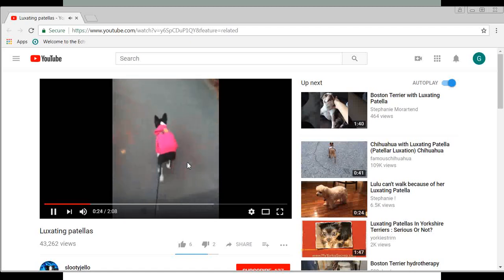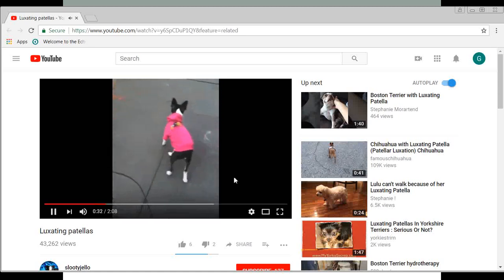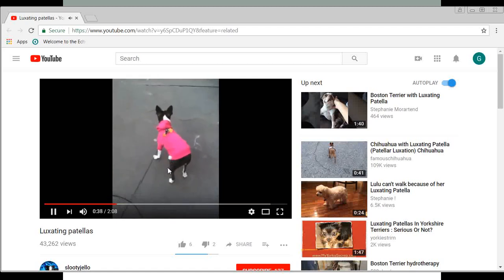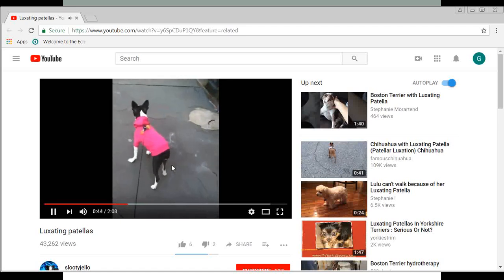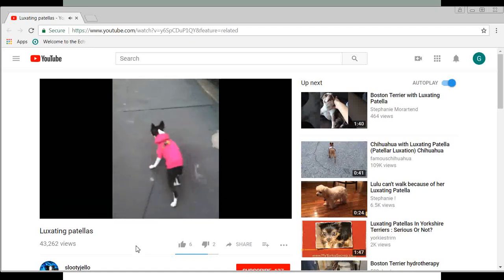The luxating patellas, you typically luxate medially. This is due to the fossa either being too shallow, so the patella doesn't fit the fossa, or the abnormal angulation of the limbs. Pretty common. He says his knees are not stable. He doesn't want to stand on them. He puts most of his weight forward. He extends his limb. He doesn't feel right. And it luxates medially.